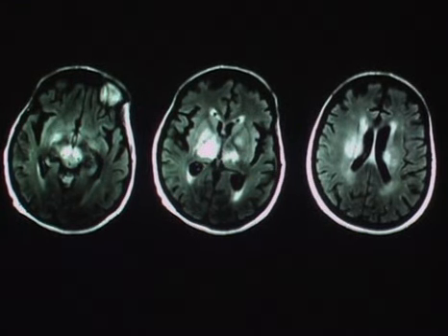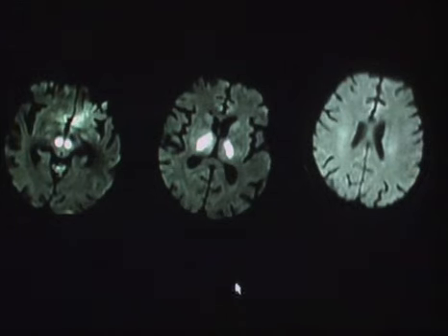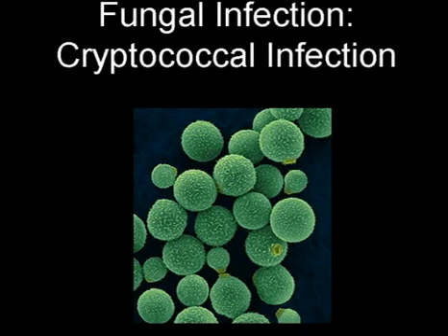But here's an example of West Nile encephalitis that we've had in our institution, and we've got a fairly interesting pattern of central gray matter signal abnormalities extending up to the corona radiata, some involvement in the brainstem, red nuclei as well, and the diffusion-weighted imaging giving us a fairly distinctive type of appearance here with the restricted diffusion in the red nuclei and the thalami bilaterally. But again, sometimes with these centralized signal abnormalities in a patient with a diffuse encephalitis type picture, consider a flaviviral or viral encephalitis such as this.